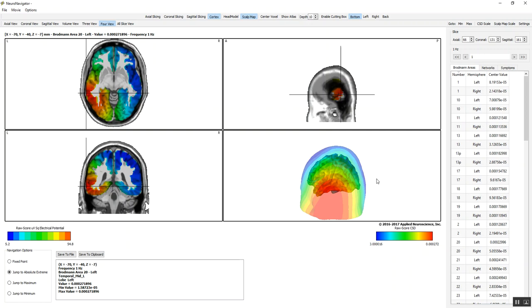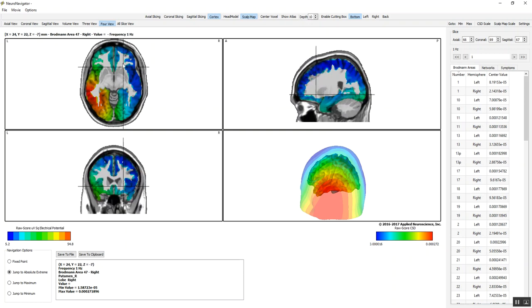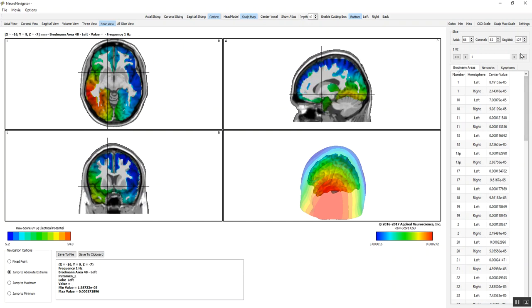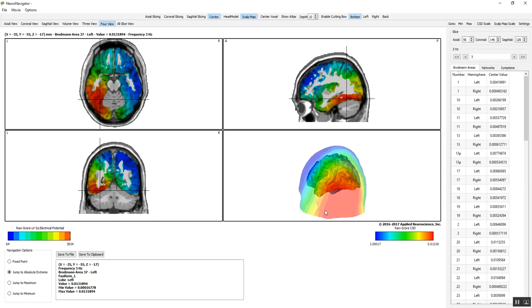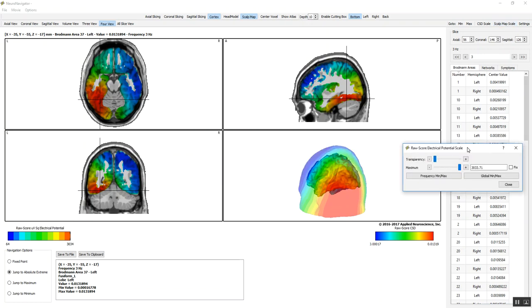In this case, we have a realistic MRI, unlike the Key Institute, that has 12,470 voxels. And I'm just scanning through this for a minute to show you the navigation tools. We know that 3 Hertz is the peak where there's most deviant, so I'm adjusting the frequency up here in the right-hand corner to 3 cycles per second. I'm also going to set some of the scaling factors here so I can look and focus in on more detail of just what I'm interested in.